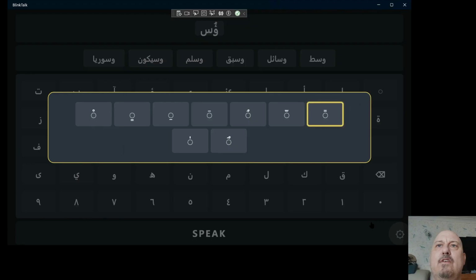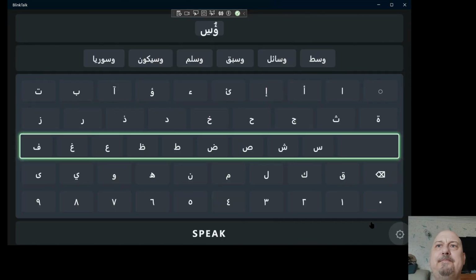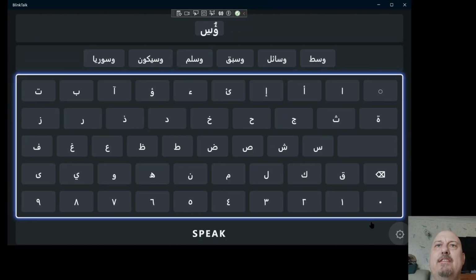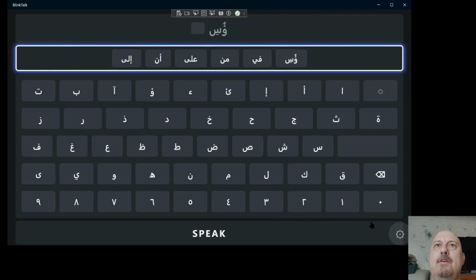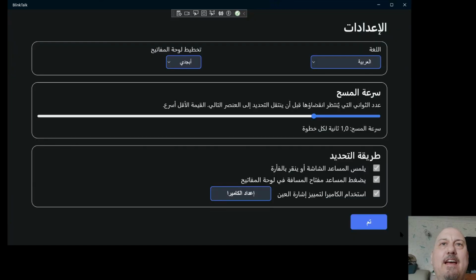I'll put a line underneath the W shaped thing. And then I'll speak whatever that is. Wassa. Wassa. Okay. Any other settings that I could show you? Oh yeah. I'll switch back to, oh, it's right to left now. So I'm actually changing the wrong thing there. That's where English has gone.